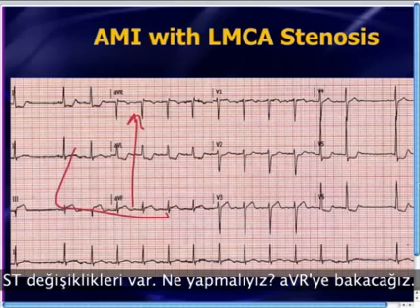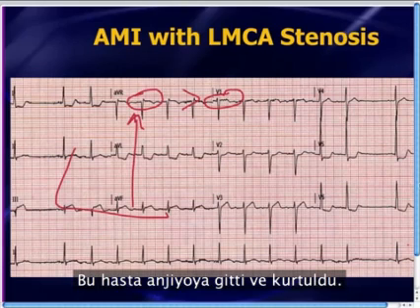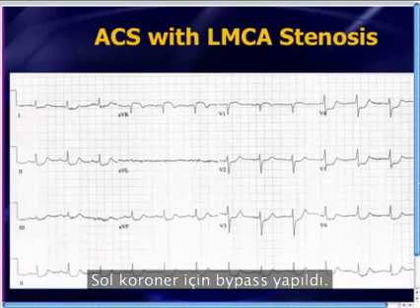We're going to look in aVR, and there's elevation in aVR, which is greater than the elevation in V1. That means left main. And this patient ended up going for cath and survived. We had a left main lesion, ended up getting bypass surgery.